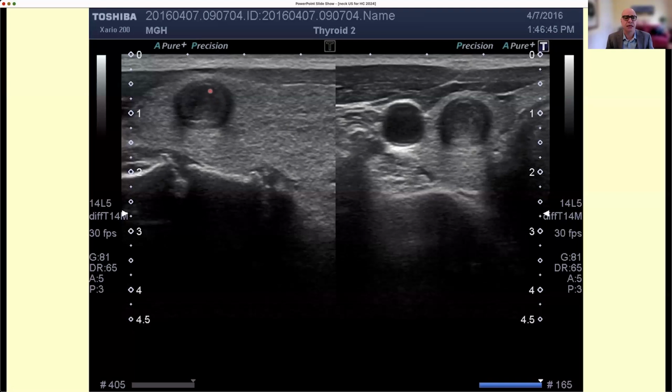So this could be a very compact tissue that doesn't reflect any echo or very few echoes, or it could also be dense fluid with some debris inside that generates some echoes. So we can't tell whether this nodule is solid or not solid, because it's hypoechoic enough to be compatible with the dense fluid, but it's also compatible with very packed homogeneous tissue that doesn't reflect any echoes because it doesn't have any interfaces.